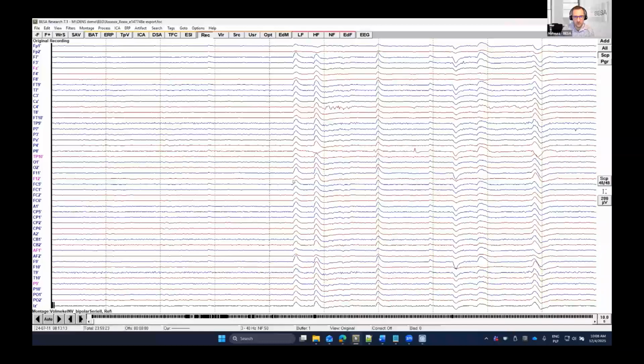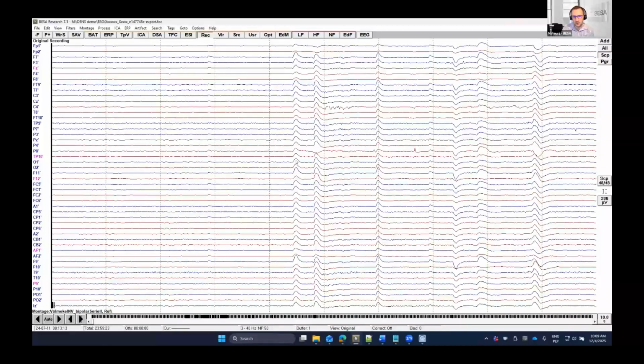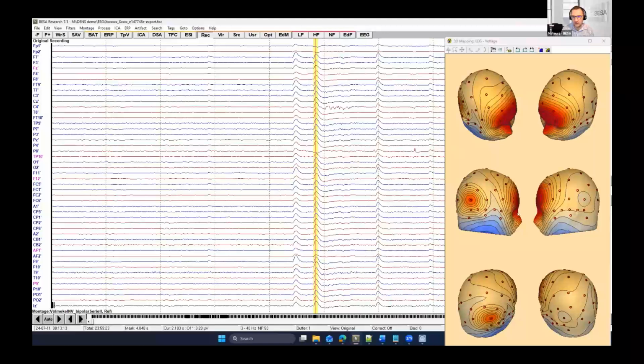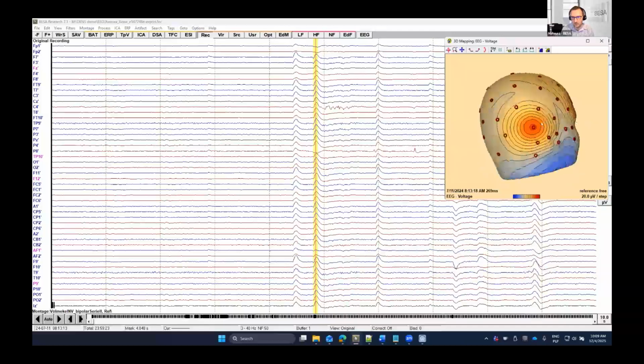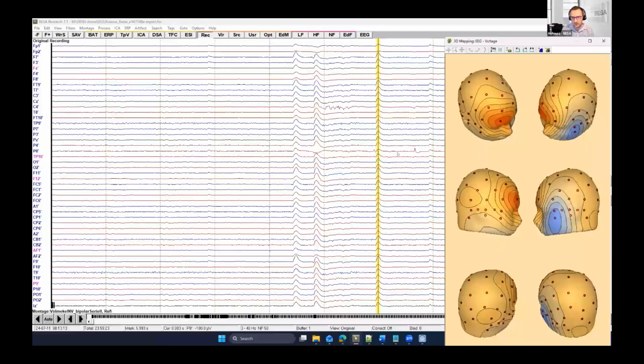The final verification is to check the channel distribution on the most known thing, like an eye blink. So let's look at how it looks. This is maybe not the best eye blink, actually. So let me check another eye blink. And when we check this eye blink, you can see something very intriguing here. We have a nice frontal topography, but here on the channel P8, we have something not typical for the eye blink. Let's see if that repeats.